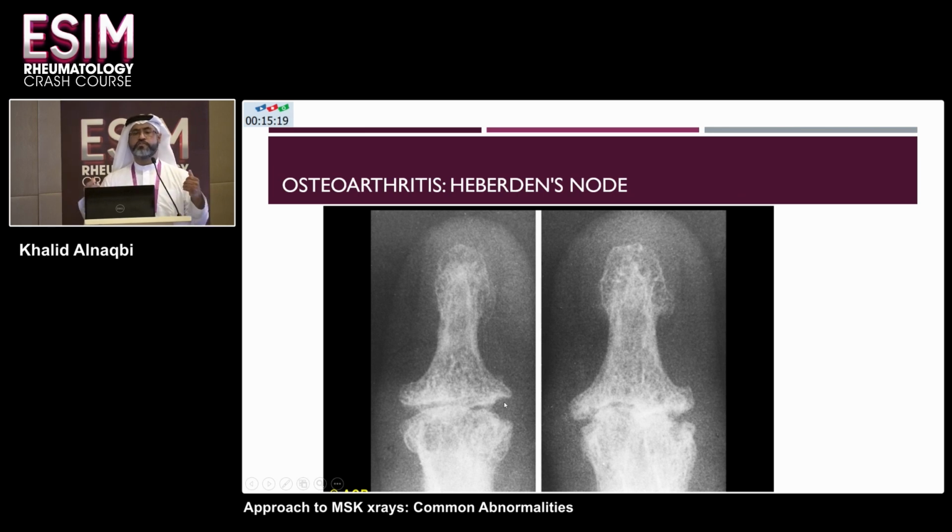Classic teaching for family medicine, for rheumatology fellows, for internal medicine. We always teach this, even for medical students. So this is a Heberden's node, which is simply called a node, but it's an osteophyte, and you can palpate it.